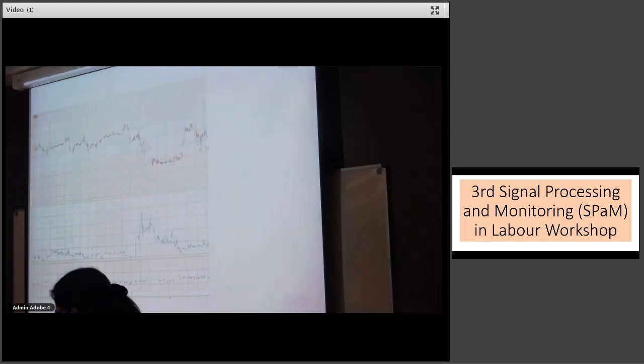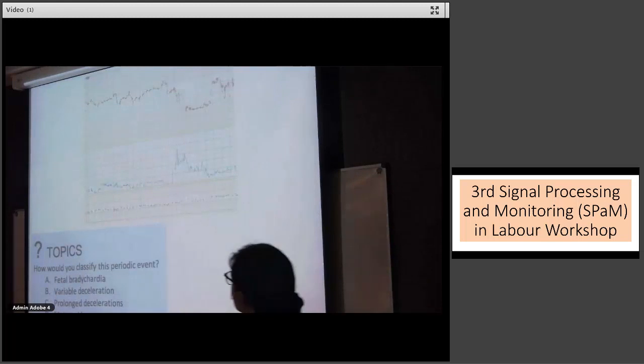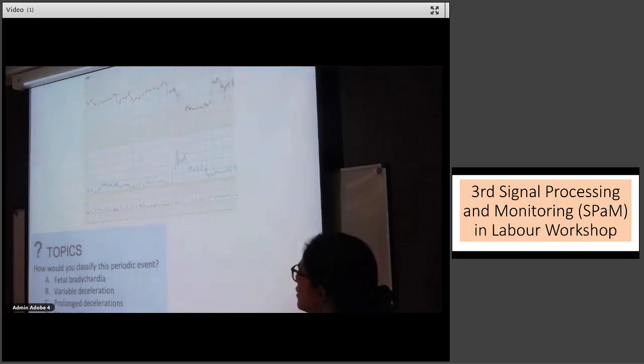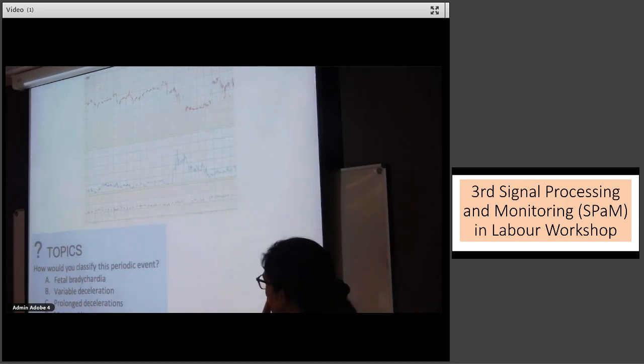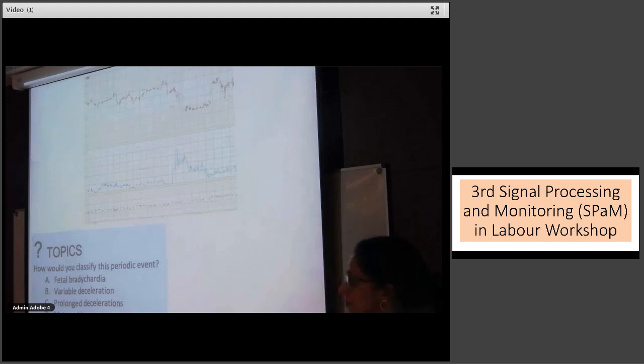Here we have this event. These are topics for discussion. Diogo, would you like to comment on this event, please? Yeah, well, think of what it is. I think it's important to give it a name. The way we deal with it is another story, but according to the FIGO guidelines, if it has more than 3 minutes, it's a prolonged deceleration. So you don't have to look for any other characteristics. It's 3 minutes, it's a prolonged deceleration.